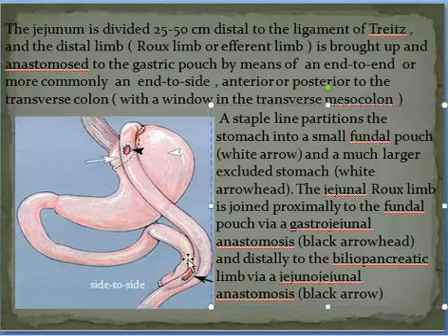So distally it is anastomosed here. There is another anastomosis here via the jejunojejunal anastomosis. So this is a new jejunum put into the jejunum. This is the jejunojejunal anastomosis. This limb is now important for biliary and pancreatic juices to be transmitted to the intestine.